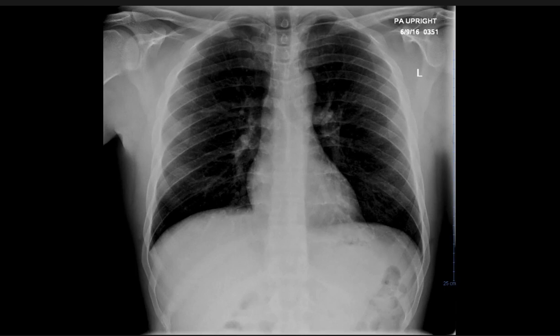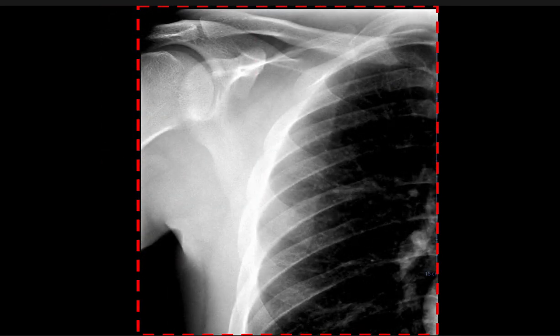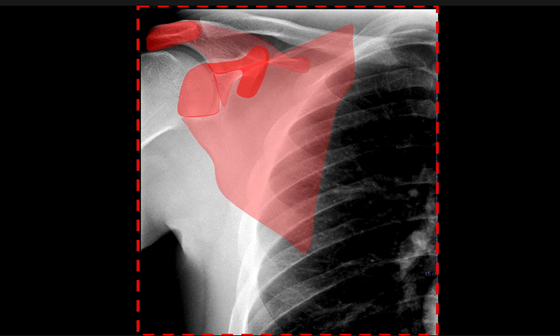Another thing that we discussed as a possible pitfall or mimic is, say we're windowing, and we notice there's a line right there, right? We see it sure enough. What is that? Is that a pneumothorax? But if we trace that out all the way around, that's actually the scapula, right? So the border of the scapula can mimic a line. And if you're thinking to yourself, lines are pneumothoraxes, especially in somebody who's predisposed to get one, you may falsely call that.